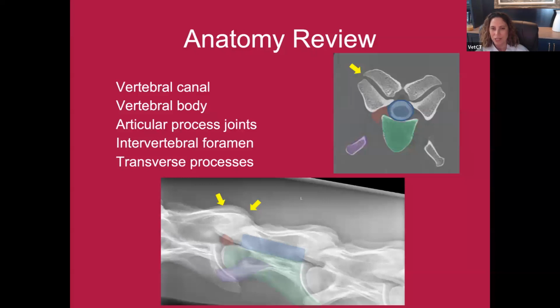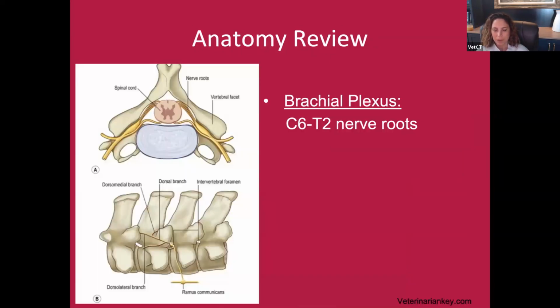And then finally, the transverse processes, and these just help us identify where we are when we're making radiographs of the spine. They can have a unique appearance at different sites, and I'm going to cover that and show you how they can be helpful for identifying anatomy.